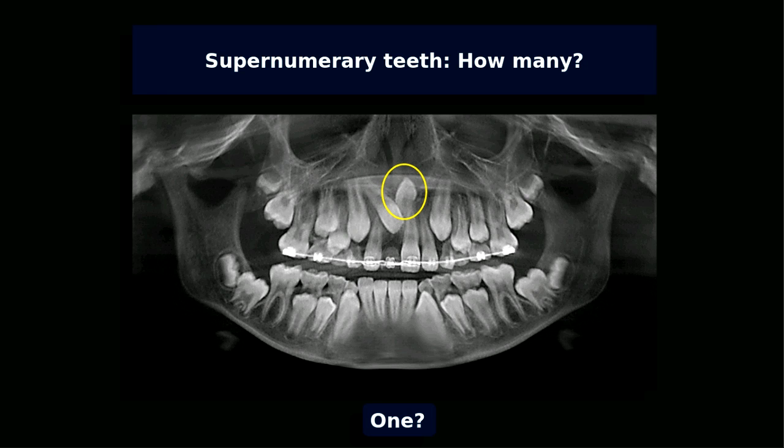Now, for orthodontic purposes, the question here is, how many supernumerary teeth you may see here. Yeah, it looks like it's here. You can actually count 1, 2, 3, 4, 5, 6, and then 7, 8, and then this is 9, 10. This is supernumerary, and likewise you can count.